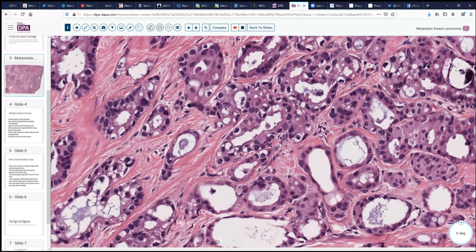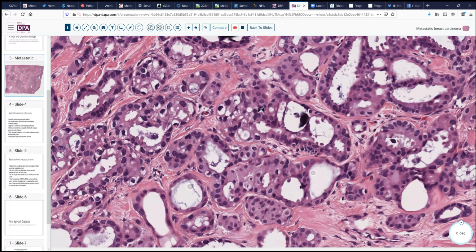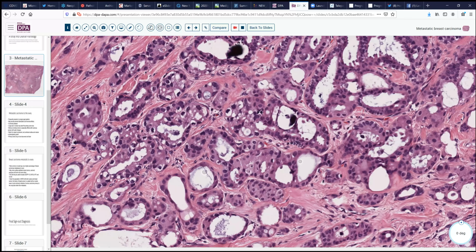Also, we can note that some of these glandular structures have a smooth lumen, while in others we see little snouting processes on the surface of the lumen, suggesting that sort of apical snout appearance. We do not see evidence of cilia in any of these cells. There are no terminal bars evident here, even though the brush border may be a little bit accentuated.